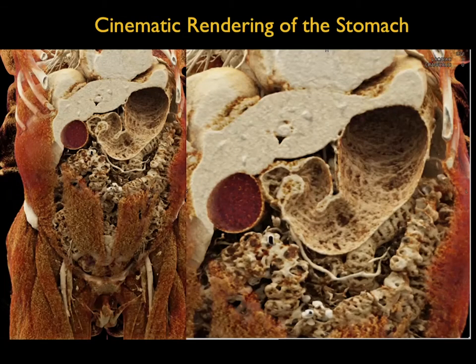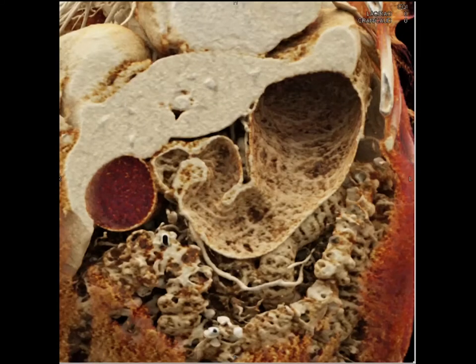Now, you move to organs like the stomach. If you distend the stomach well, look at the fold pattern. Look at the antrum. Look at the detail of the lighting model and what you can see. And again, you can see here as we go through the imaging, the type of detail we're able to see.